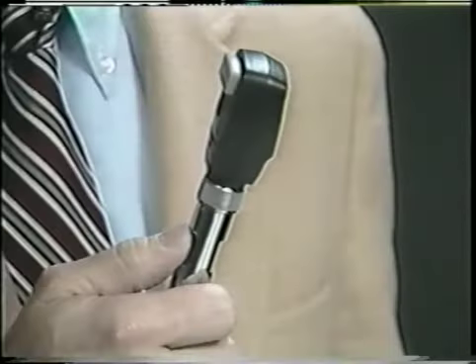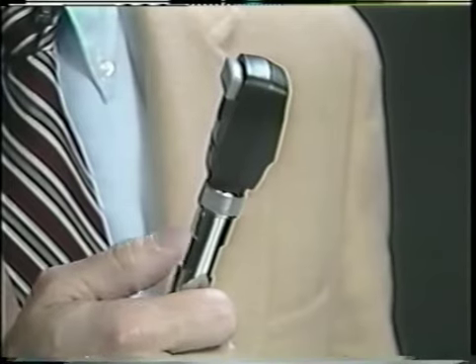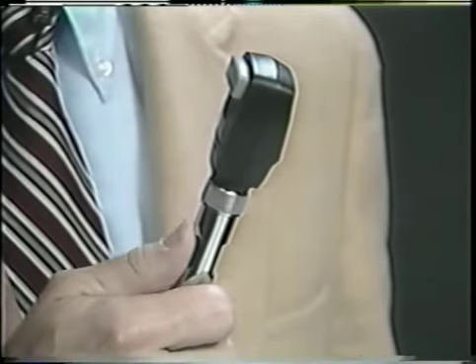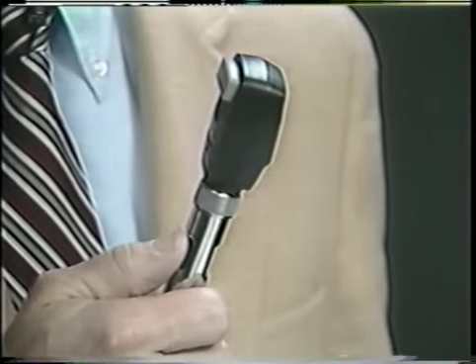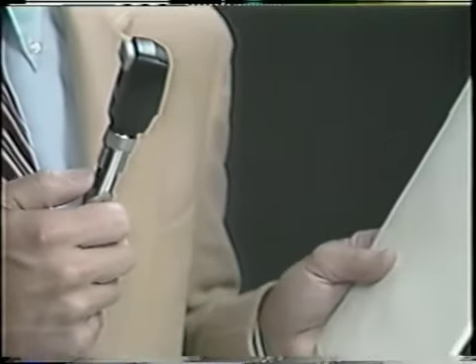The basic principles of these retinoscopes are the same as the Copeland scopes, but the sleeves of all of them except the Nikon work in the reverse direction. If you use one of these reverse action scopes, you must almost always hold the sleeve all the way down during the neutralization techniques we'll be using. If you are ever uncertain of the correct position for the sleeve, just hold it all the way in the direction which gives a broad, defocused intercept, not a narrow focused one.